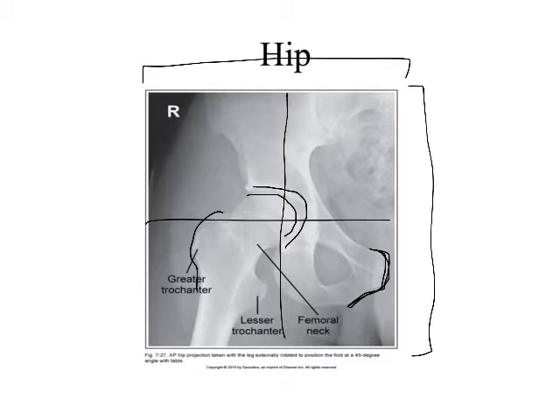They may say, I want to see both of the ischial tuberosities, because in surgery what they might be doing is aligning the lesser trochanter to these ischial tuberosities for their measurements. Those are bony landmarks that they use in surgery. But for our purposes, the main thing that we're looking for is something that is centered on the head of the femur within the acetabulum, and has a medial border related to that side's ramus of the pelvis.